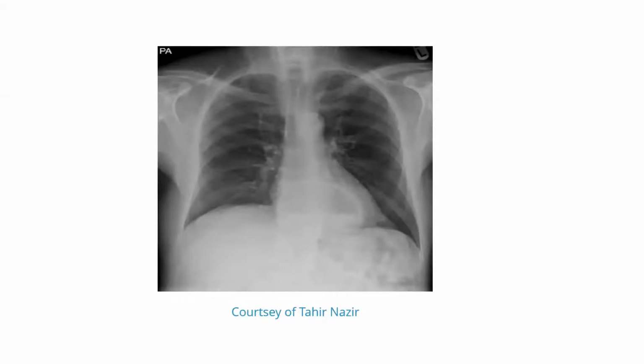There is an air fluid level behind the heart. Yeah, it's very good. Actually, you snatched the diagnosis. Exactly. So what do you think about this?